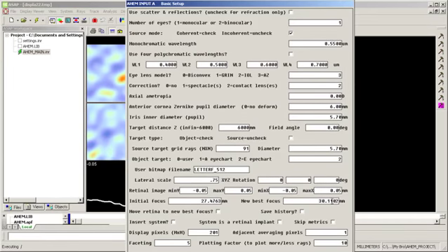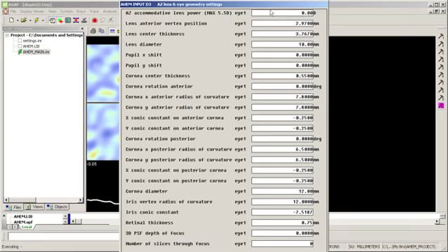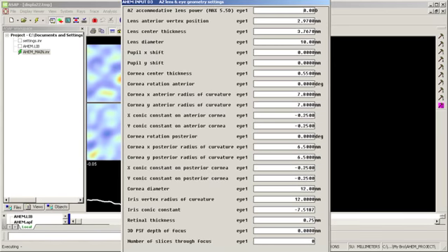So I've got a retinal window, the retinal window we saw here, and I've done some correction with the toric lens. So I click OK. Basic eye geometry is shown for the AZ eye model. Click OK again. I don't need to change anything here.